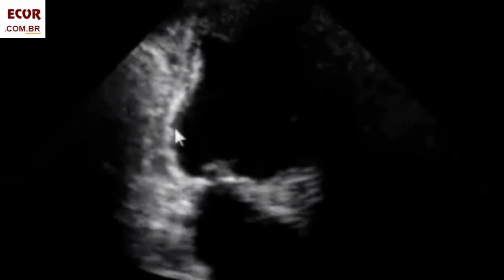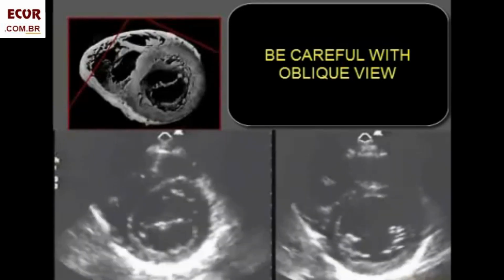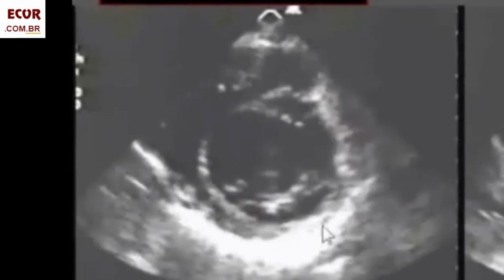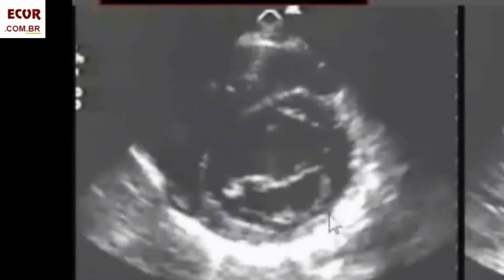In this case, there is a bright wall that seems to be contracting in LV mid-third, and when it thickens, it produces a line of reverberations down at the basal portion, giving the wrong impression that the wall is thickening, but it is not. The reverberation line can be seen even behind the left atrium. Be careful also with oblique views. Look here at this short axis at the mitral valve.